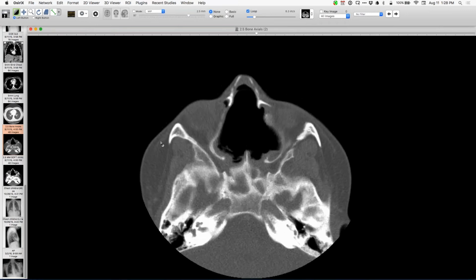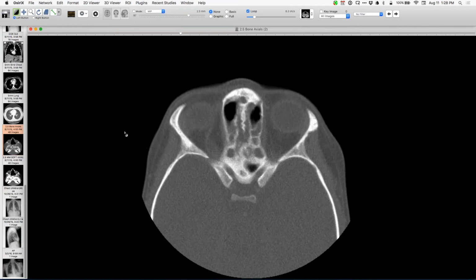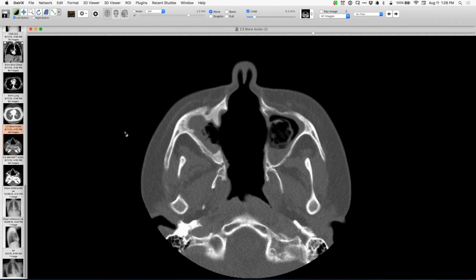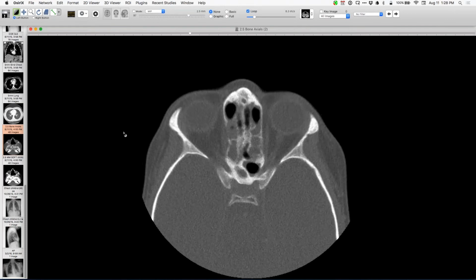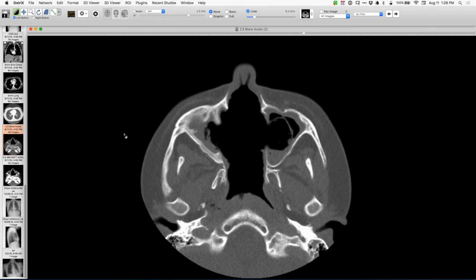Howard, was the 3D stuff at the beginning the same case? No, a completely different one. When I saw this one, I was reminded of that patient that I'd seen and showed you, a different person entirely with a severe ulcerative mucosal GPA. That was GPA as well, though. Yes. It was an adult. It presented that way with an acute tracheal GPA.